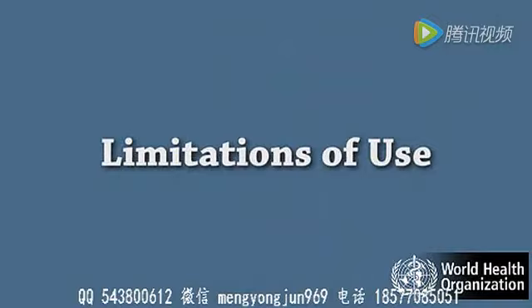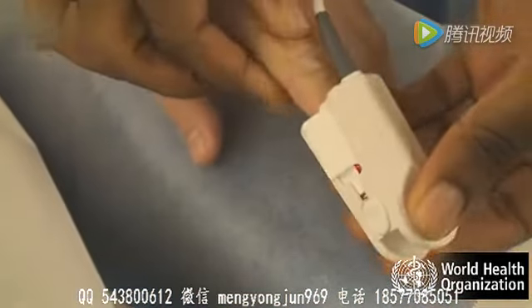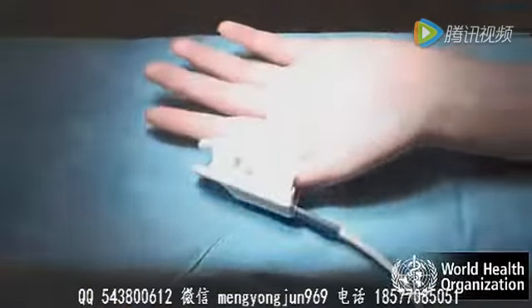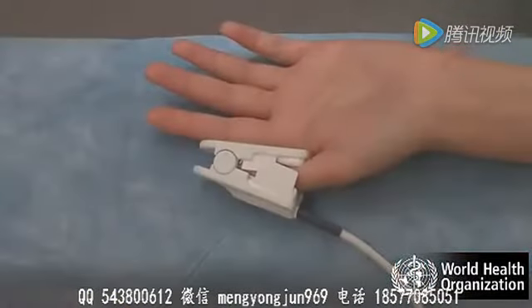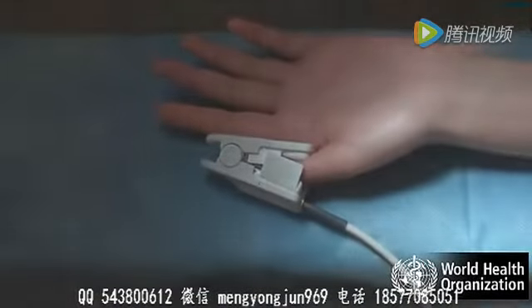Limitations of use. Several factors can interfere with the correct function of a pulse oximeter. Light: bright light, such as the operating room light or sunlight, directly on the probe may affect the reading.